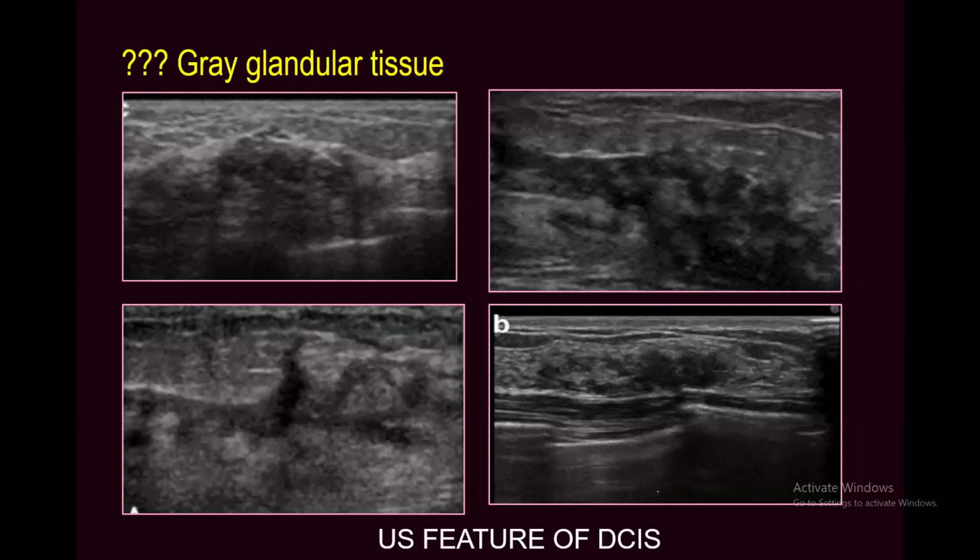If it represents a high-grade ductal carcinoma, I mean a well-defined lesion with diameters, at the end I will measure for you the span of this lesion.